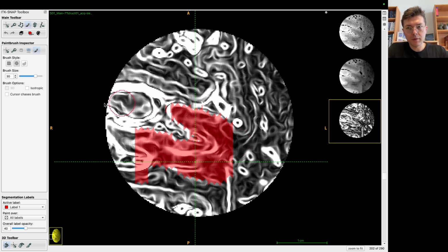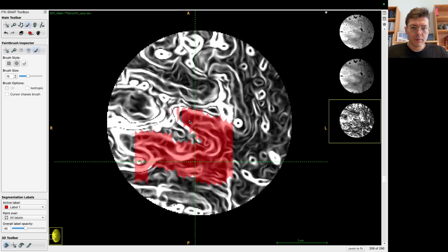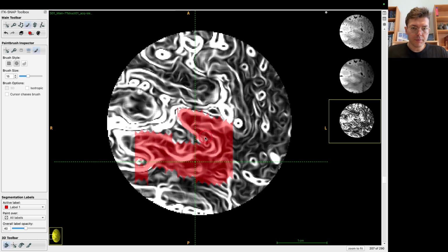Now, as I said, it's similar to sculpting. So every time we do this filling in and polishing a bit, we can go a bit smaller. Okay, I see, for instance, that part can be taken. So now I can do every fifth. Still filling in stuff, polishing it a bit.